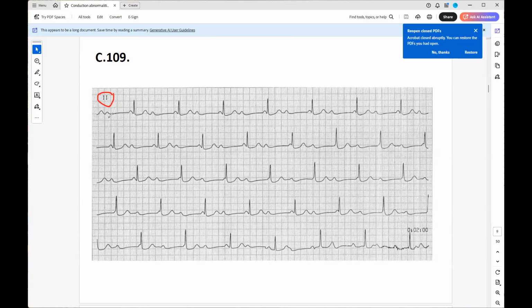That's very good. So now, one thing that you mentioned is rhythmic. I assume that you are right. We do have P waves, that's correct. And it looks like every second P is conducted.